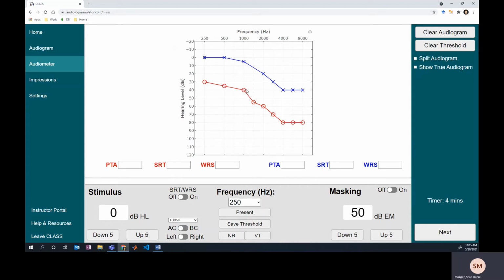We'll compare the air conduction threshold of the test ear to the bone conduction of the non-test ear to see if we need to cover up that signal at all. So I can already tell right now that even just comparing air conduction, we are going to need to mask some of these, but it's on the fence for some other ones. Like here, going from 0 to 35, that's not a 40 dB difference, but the bone conduction might be slightly better than the air conduction. There might be a small air bone gap here, and if that's the case, then we might need to mask this anyway.